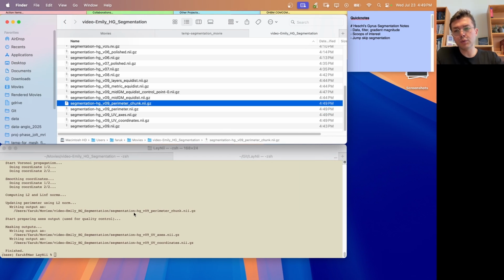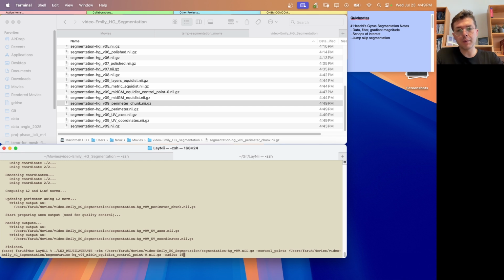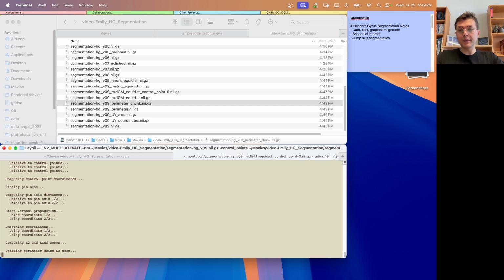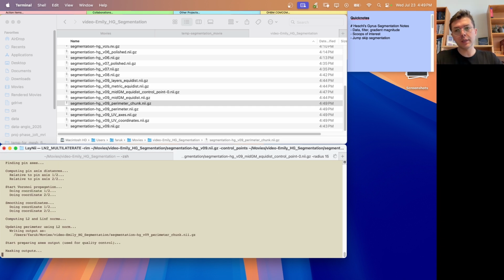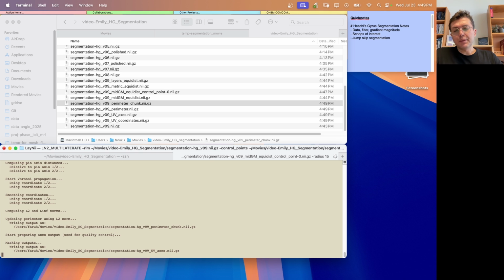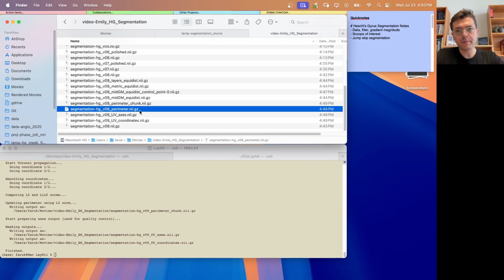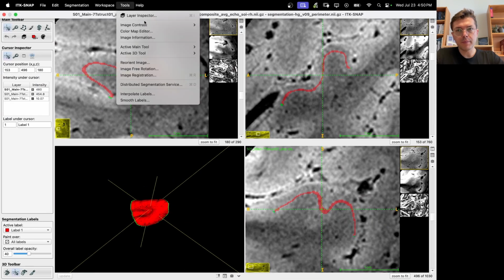In my 2022 paper, the size of this disk was 15 millimeter in radius. So if we fit 15 millimeter in radius, we will be basically on the way to replicating what I did for my 2022 paper to analyze the Heschl gyrus. And it might be a good idea to just keep it at 15 and center that on the Heschl gyrus because I already have that data processed. So in case we need, I think 5 more subjects that I have analyzed in 2022 and combine with this data in the future if we want, we will have the same amount of disk already processed. So that's the advantage. Okay, let's load this guy.